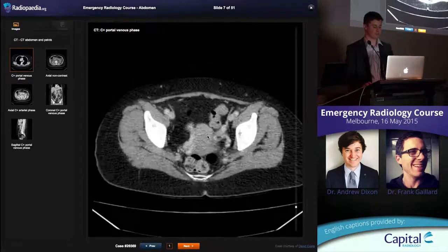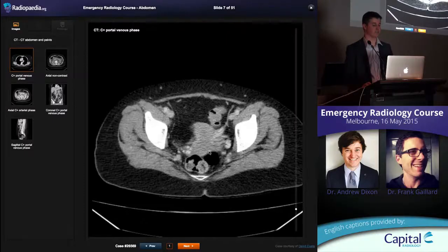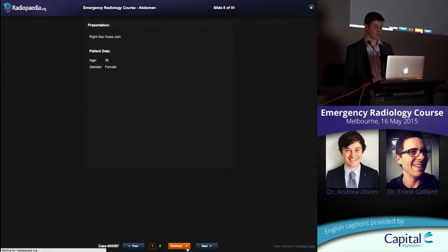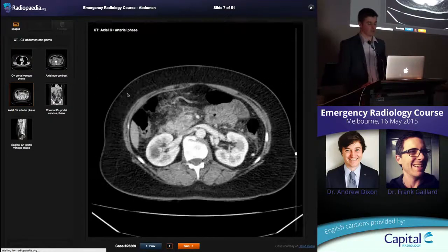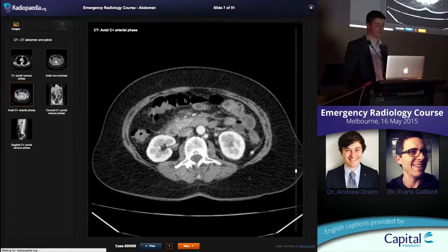Down in the pelvis, we're seeing just a little bit of free fluid. You do get a bit of reactive free fluid in these patients. Okay. So pancreatitis. The key with pancreatitis these days is they're often doing an early prognostication CT to try and predict any complications.